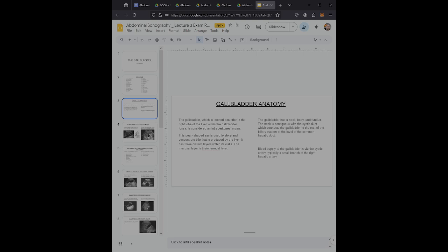There are certain normal variations in the gallbladder shape. You can have a bilobed gallbladder, an hourglass appearance, a septated gallbladder, and this appears as multiple thin septations, a Phrygian cap, Hartmann pouch, or junctional fold.